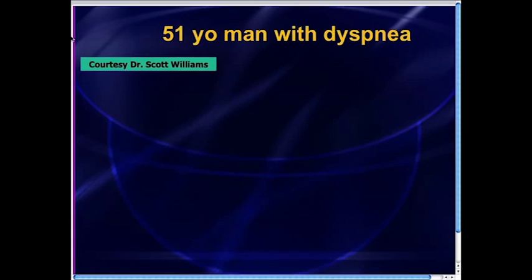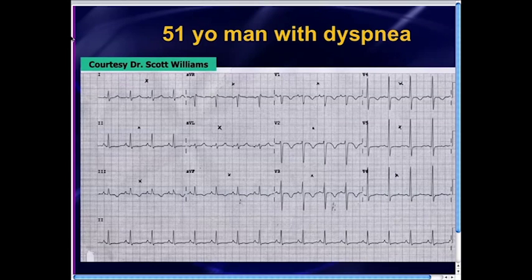This week's case, initial case at least, was provided by Dr. Scott Williams, who's an attending physician at York Memorial Hospital in York, Pennsylvania. I ran into him at a board review course, and he had this EKG to present. He's a 51-year-old man that he and his colleagues took care of, who presented with severe shortness of breath.